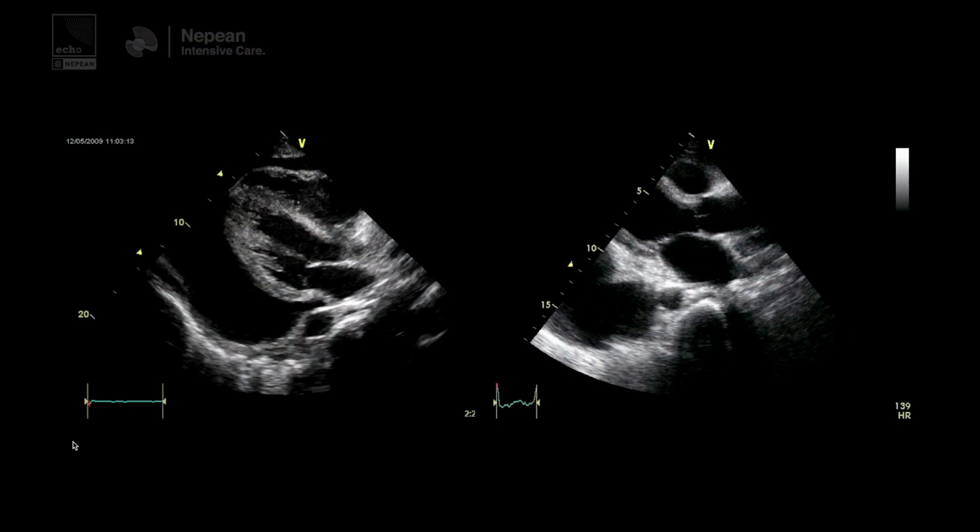We talked, looking at that image, about the fact that pericardial effusions tend to split the left atrium from the descending aorta. That's one of the really nice things. You can see that disconnect between the two that are normally adjacent to one another. And that's one of the telltale features. I think it's the most helpful. It is. It really is.